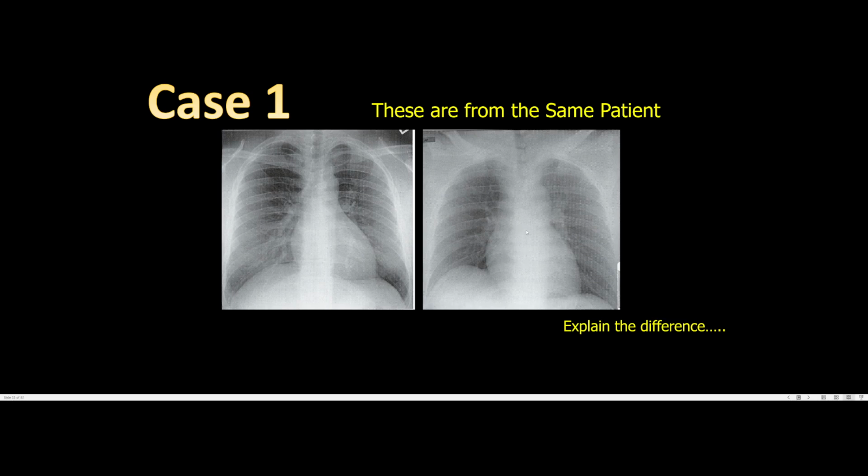Typically, patients are lying supine, and they'll be having the radiation source right in front of their chest, and it will have radiation coming from the front and then towards the back, an AP view. Well, the picture on the left is a PA view, where the source of radiation will be the opposite. It will be from the back and then towards the front, so a PA view.